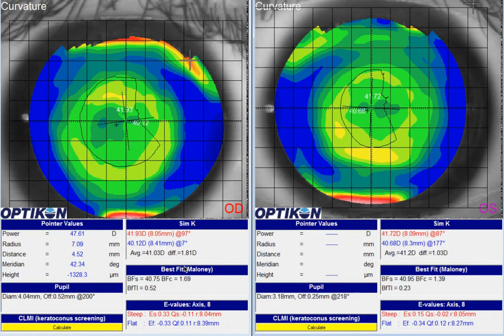In this orthokeratology case, we have a patient whose cylinder correction, which is mostly with the rule and mostly on the cornea, has gotten worse after lens wear. And usually that will happen when we have a lens that is fitting horizontally differently than it fits vertically. If we look at the posterior topographies, we can see that we get good blue alignments on the temporal and nasal edges of the cornea, but superiorly and inferiorly we're getting these greenish aqua puddles. And we can see that the lens is not sealing off or bearing down as much vertically in either eye.